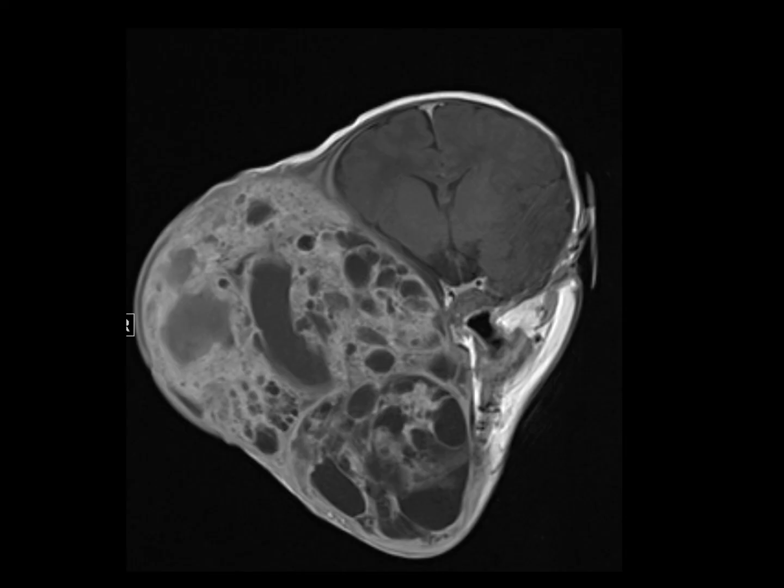We did the post contrast. In this case, we made a mistake, so I show you also some mistakes, and we left the fat on, and so we didn't do post contrast fat saturated images, and this makes it a bit more difficult to distinguish the limit of the enhancing tumor from the subcutaneous fat. So remember, you need to add fat saturated post contrast T1 every time.